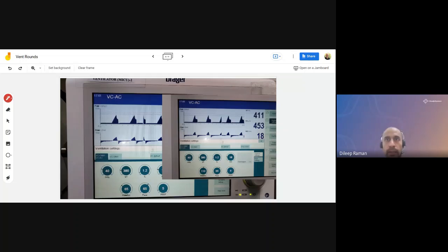Okay. So now the other question Vibi had was, is this set point or is it adaptive? In this case, it's actually set point, because the user has set the flow acceleration, and that is the fixed rate at which the ventilator is going to pressurize the circuit. There is no adaptive target here, meaning the ventilator is not going to change the rate of the slope to meet a tidal volume target.